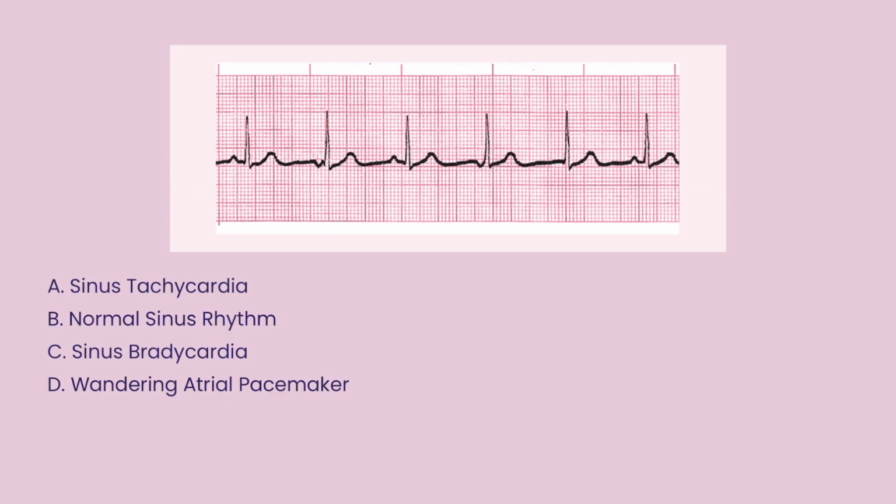Alrighty, what do we see? We've got a P wave. This one looks different. And then we kind of morph into something. So while we don't really have 1 to 1, there's not really a P wave here. But the P waves don't all look the same, and that's what I want you to focus on, even though our rhythm looks like it's regular and our QRS complex is narrow. If you were to immediately look at it and kind of just jump the gun, you might say that it's 1 to 1, even though it's not.